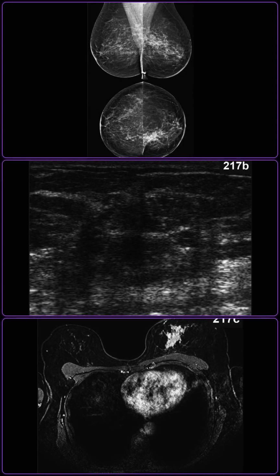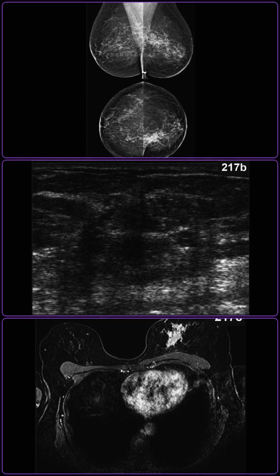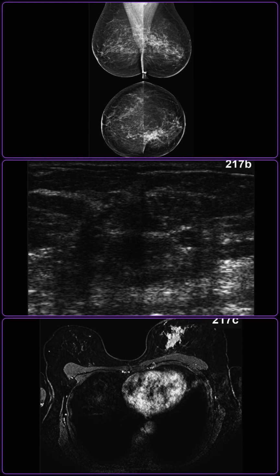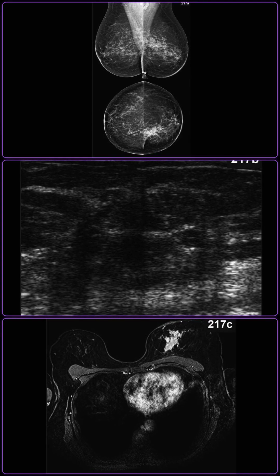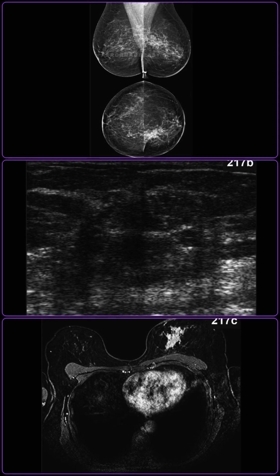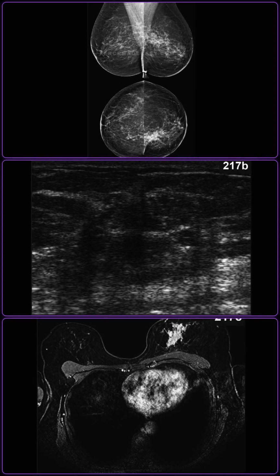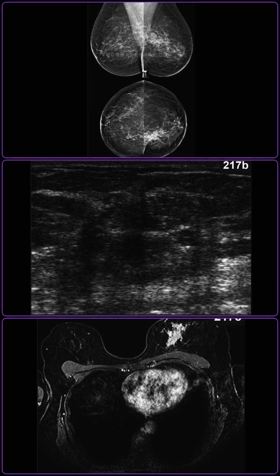As a radiologist, I would recommend comparing these mammograms with prior films to evaluate for newly developed or progressive asymmetry. I would suggest performing an urgent ultrasound-guided core needle biopsy of the left breast architectural distortion. I would recommend performing a complete bilateral breast MRI to accurately map the extent of the disease and screen the contralateral breast for synchronous cancers. Finally, I would document the findings, assign a BI-RADS 5 category, and immediately refer the patient to the breast multidisciplinary team for surgical staging and oncology planning.